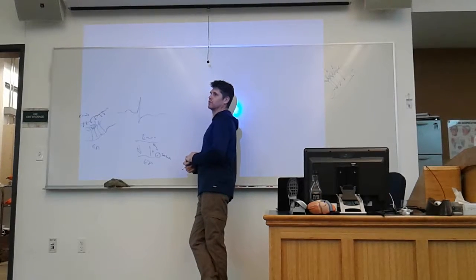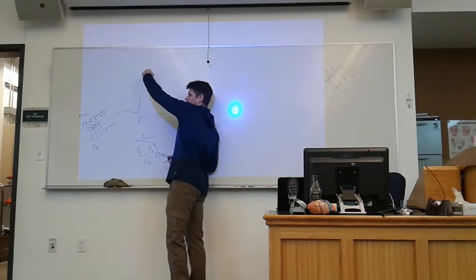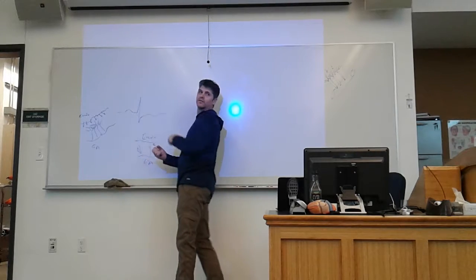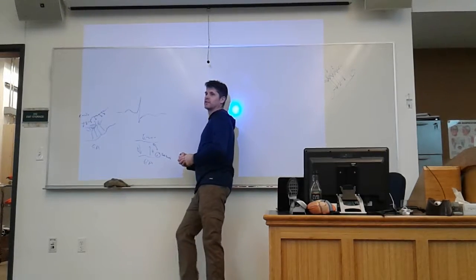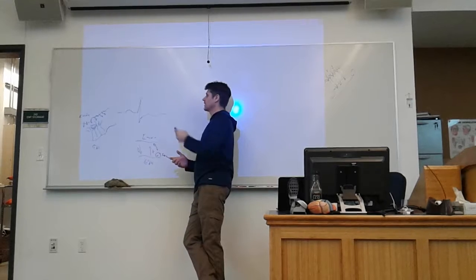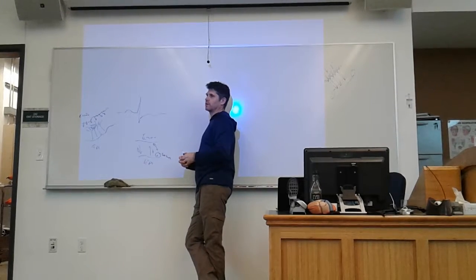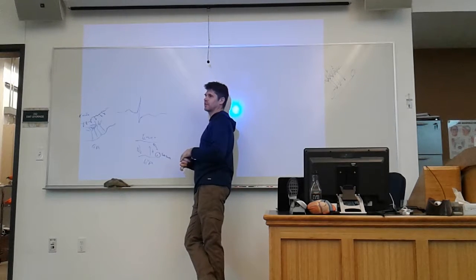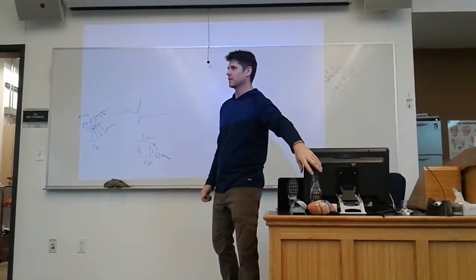Okay, so how do you figure that out? What else can you use to help you know where your T wave is? Find the baseline. What's right here? Or right here? Different leads. That's right. You can start looking at other leads to get your exact timing down of things. And as you get your exact timing down, you can start to go, okay, I know where that T wave is in this bad area of the heart. That's why we have different leads, because in selective areas, it's going to flip. The areas that show the ischemia. That's correct. Because the areas that aren't ischemic won't show ischemia.